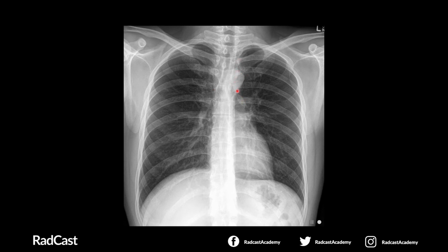Here is the aortic knob. Usually, it should be crisp and clear to outline. Sometimes you can see calcifications in this area. However, we do not see any here. You can also check for the mediastinal width using a ruler. It should be less than 8 centimeters on a PA film. Finally, you can check for the hilum to ensure that the left hilum is usually higher than the right.